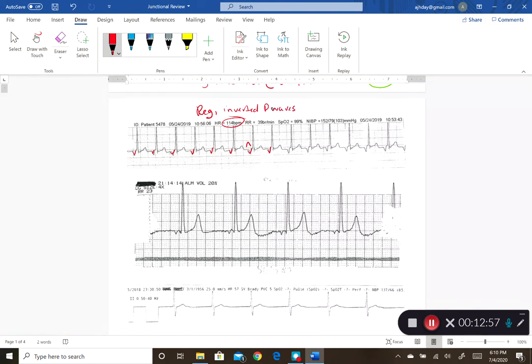I do have 1 P wave for every QRS complex. Next, I'll look at my QRS segment, very narrow, probably only 1 block. So it's telling me it is coming from above the ventricles. I don't have any wide QRS complexes. And then lastly, we'll look at my T wave. So there's where my QRS ends and where the ST segment goes into the T wave. So it looks like there is no ST deviation there, no ectopy.